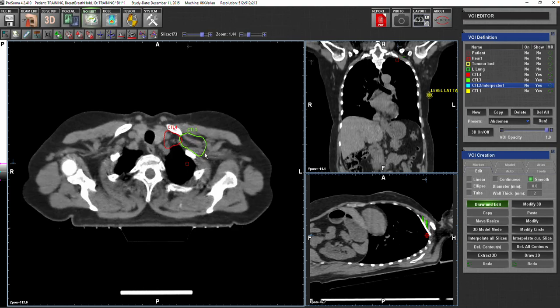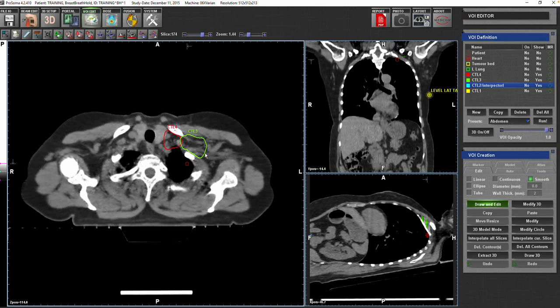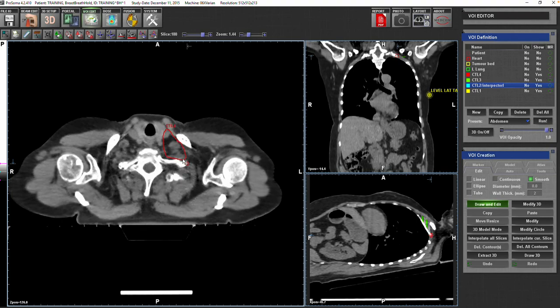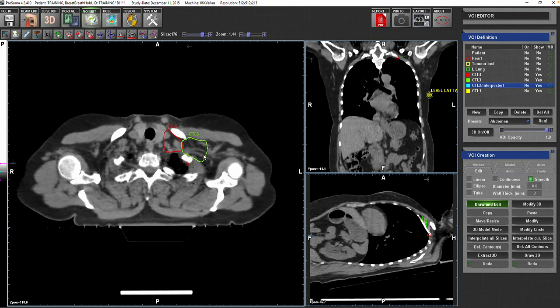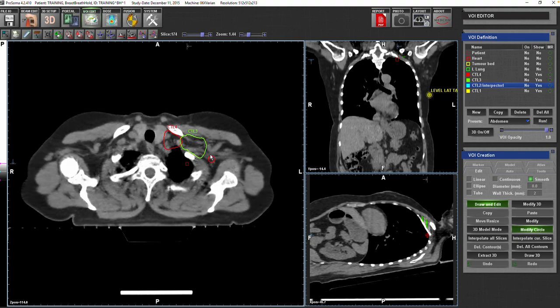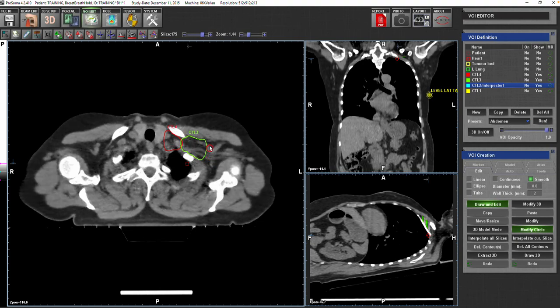I wouldn't care much, honestly, but I would be generous and I would make sure that the veins are covered properly. So if you think that, okay, this is the artery I'm following here, and now the artery is coming just above, about to touch the pectoralis minor, that's fine. You can just draw it. If you think that this is too high, you still can go on down. It's very variable. It's not something that you have to do like that, especially without using a proper contrast.